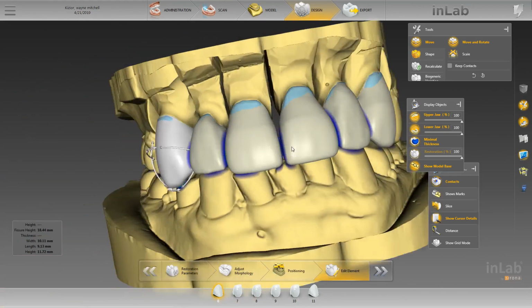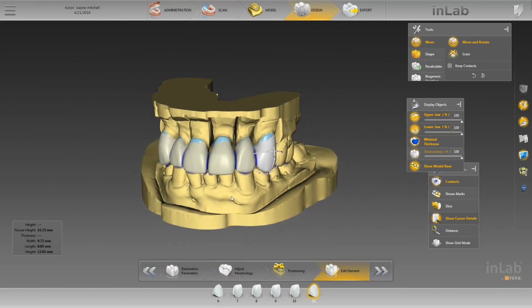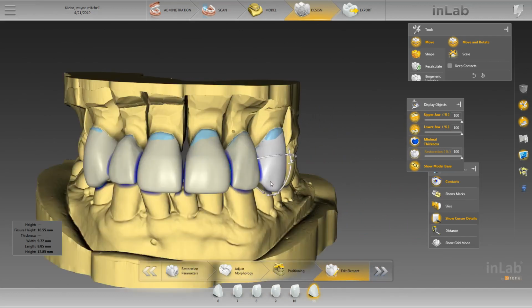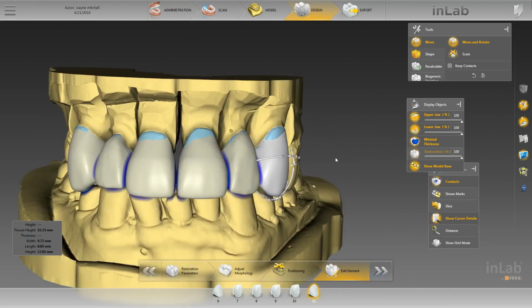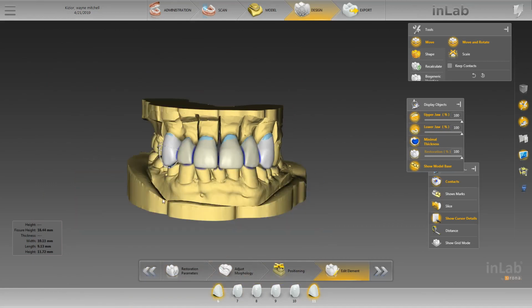And then, you know what? I just realized after you use biogeneric variation, pretty much all adjustments that you make to the teeth go away. So we're going to first do biogeneric variation, then increase the length of the cuspids.